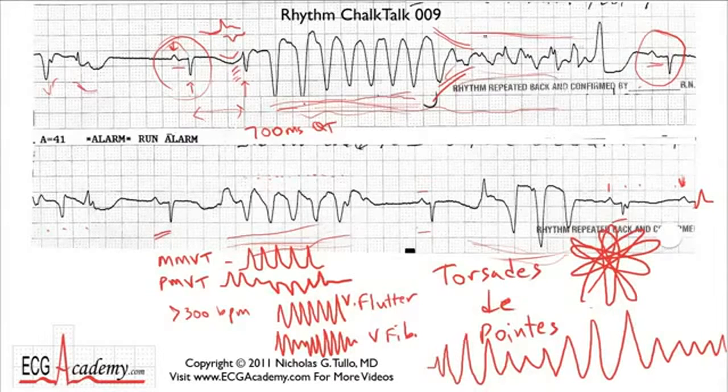So you've got this polymorphic non-sustained VT. It can become sustained, and it can sometimes degenerate into ventricular fibrillation. Torsade can. But what's causing it all? Well, this really, really long QT interval, I think in this particular patient, the cause is the drugs. So what you're dealing with here is something called drug-induced long QT syndrome, because Effexor is known to increase QT interval in some patients, and certainly Levaquin has been reported to increase QT intervals.